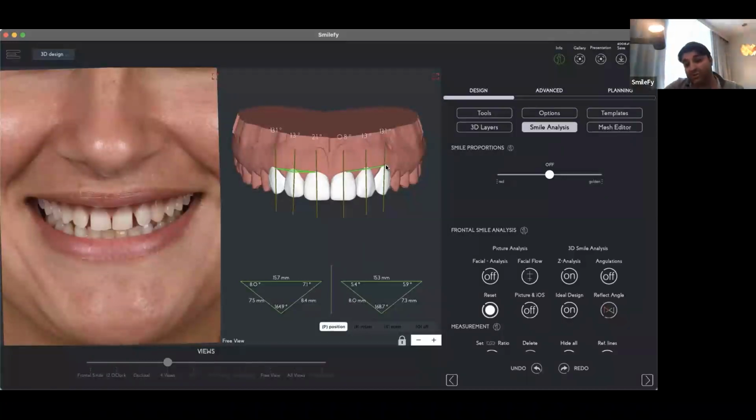So with a gingivectomy treatment, with maybe crown lengthening, now you can analyze and diagnose the situation of the patient and think how you can improve and create a symmetric, beautiful smile, and how you can improve everything else in the smile.